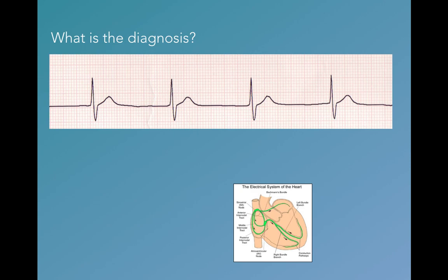Okay, so what's the diagnosis for this rhythm strip? Now, the first thing that hopefully you observe is that there's no P wave, and the rhythm appears normal. So what you would want to do is say, okay, there's no P wave, what's the QRS? If you look from the beginning, there's no real Q wave, so the upslope of the R wave to the end of the S wave, there's 3 small boxes. So 4 times 3 is 12, so if you use the right units, it's 120 milliseconds.